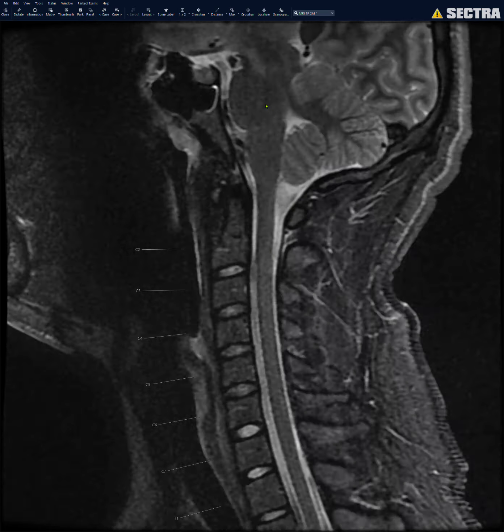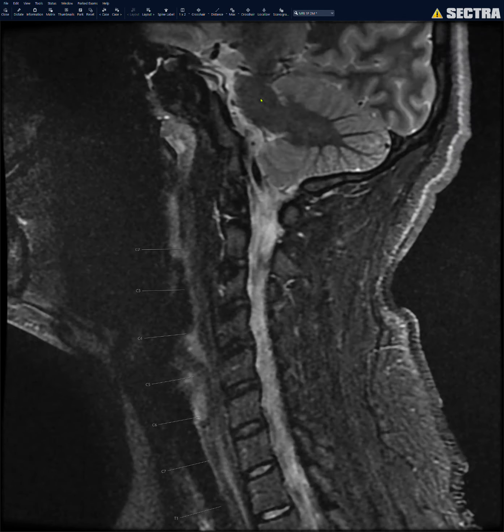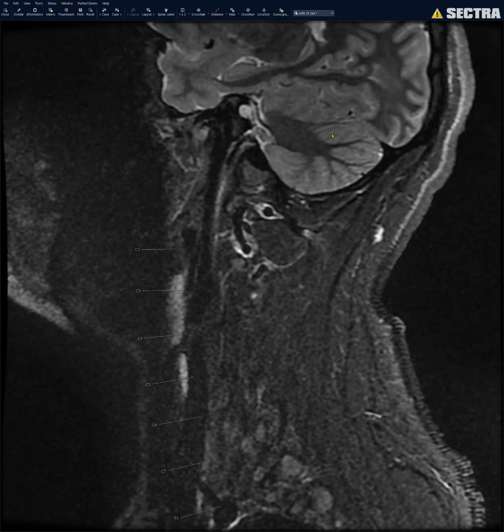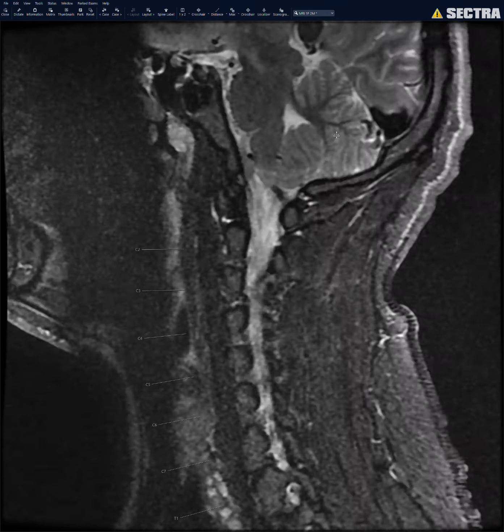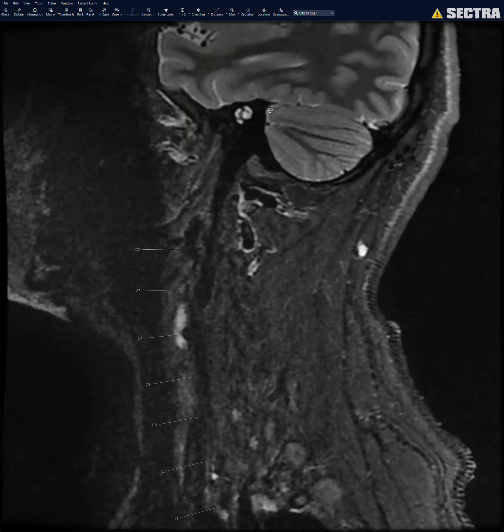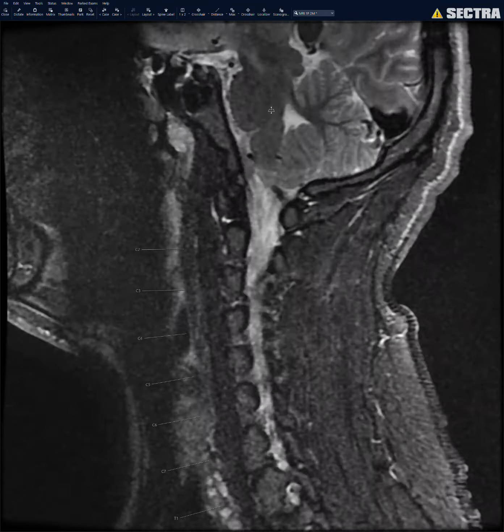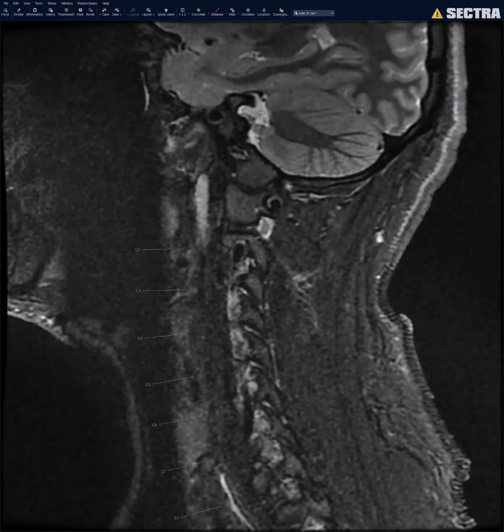Sometimes you can see chronic pontine infarcts or chronic white matter change in the pons. Then I look at both sides. I look at the cerebellum on both sides; sometimes you can see little cerebellar infarcts, and you don't want to miss that. Then I look at both sides of the brainstem. Take a quick look at the cerebellopontine angles, and make sure you don't miss a mass there.